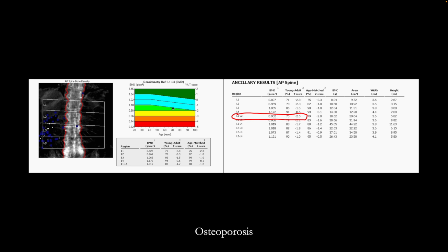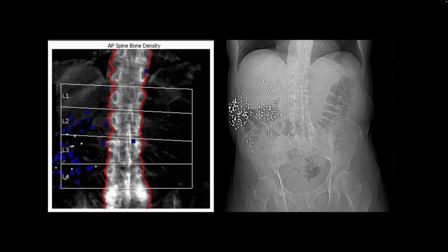So the teaching point here is when you see abnormalities in certain vertebral bodies, in that situation, you can exclude those vertebral bodies from analysis and use other vertebral bodies to make a better diagnosis. So here we call osteoporosis, and we know, as we saw earlier, that the hip region showed osteopenia. More images from the same patient showing degenerative sclerosis, and all of these artifacts that the technologists are trying to remove or black out from the analysis.